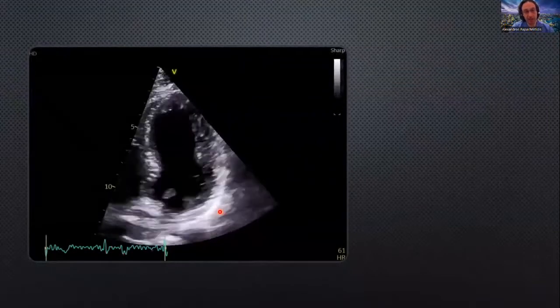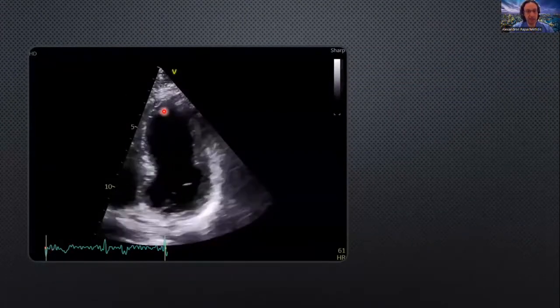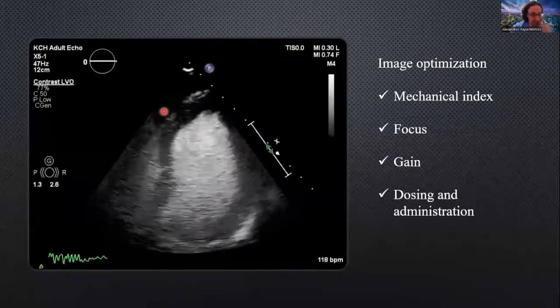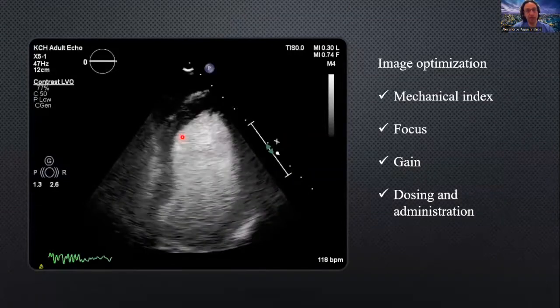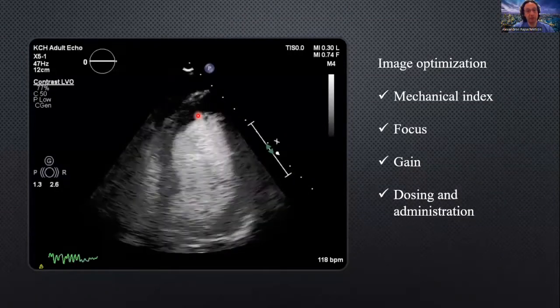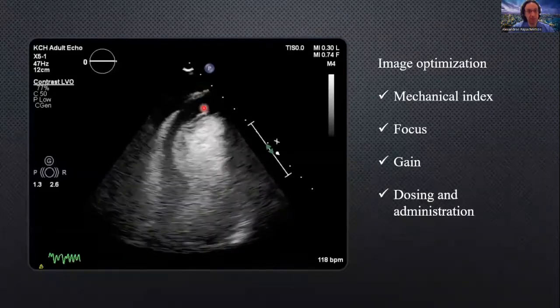Another patient with an LAD infarct. You can start seeing something here in the unenhanced images. And during the contrast, we can see that actually the contour here is not as round as it should be, and the apex is not very thin. It's a good setting, I would say. You can appreciate the lack of motion here.